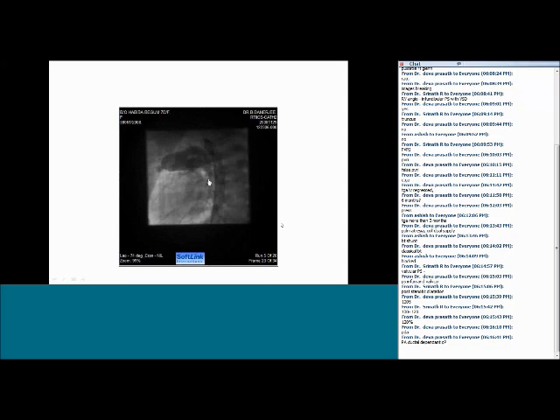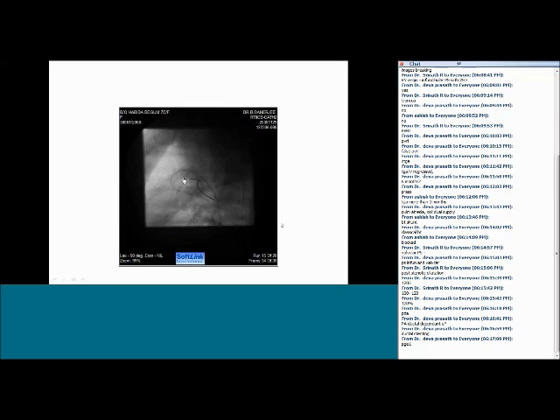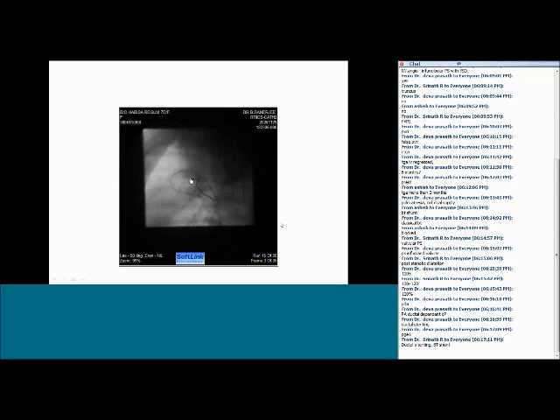So what would you propose for this patient? What treatment would you propose for this patient? This is a 7 days old child. Ductal stenting, that's what you have done in this patient. What else? Or a neonatal BT shunt. Yeah. Of course, this patient is on prostaglandin because you can see a very large ductus, and you see one stent is there.